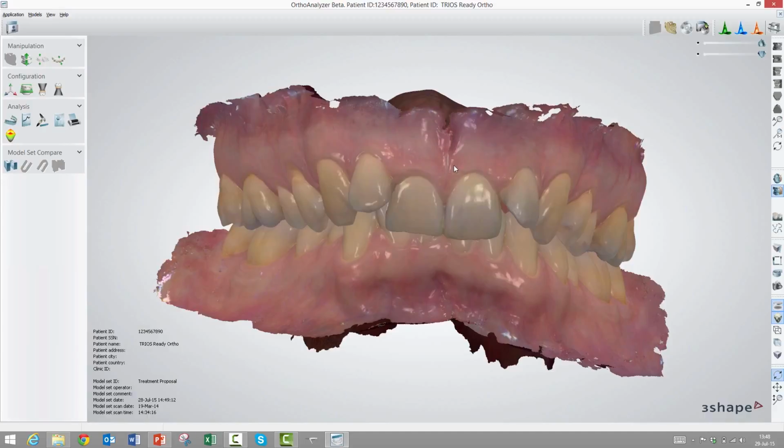There are 2 things you can do really. You'll notice that each of these icons in the toolbars are in certain sections, and each section is put in here by this dotted line. You can expand this if you want, or you can move it around if you want. Normally, if you want to place this group of icons elsewhere, you just move the dotted line to another place on the screen if you would rather have that. And this goes for the visualization toolbar as well.